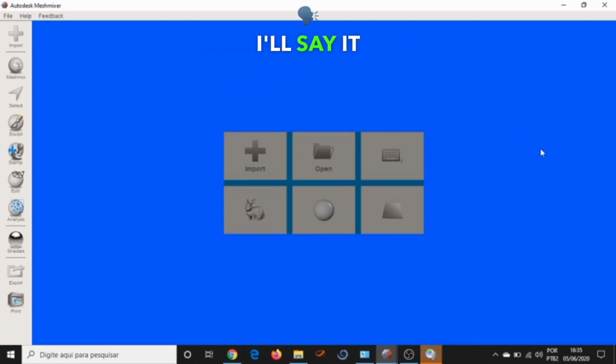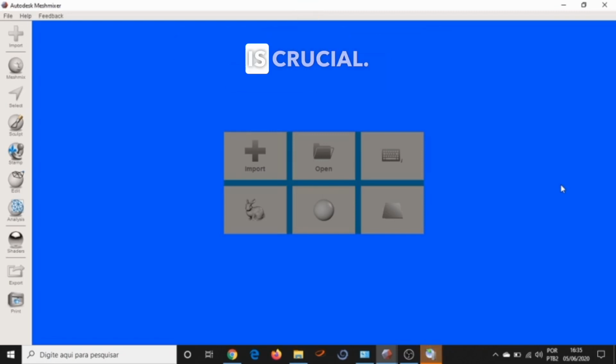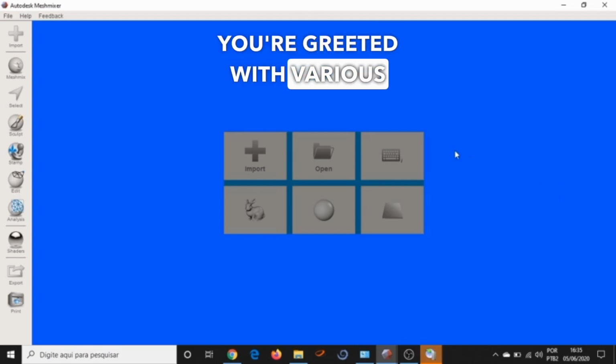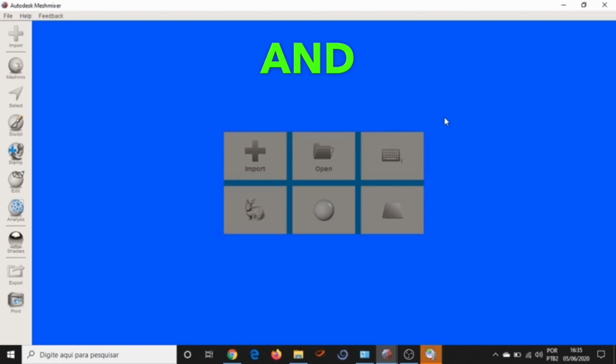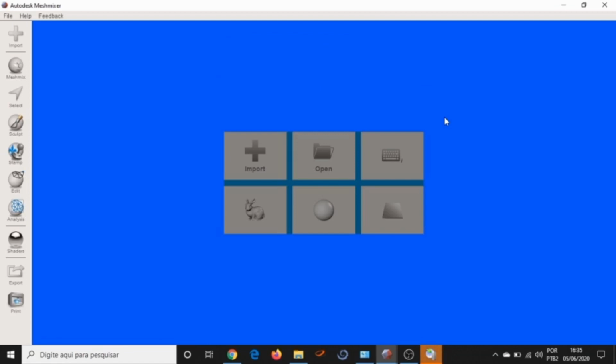As I said, and I'll say it again, we had the idea to do this course starting with an introduction of the software itself, which I think is crucial. So the moment you open it, you're greeted with various tools, but let's initially focus on these 6 tools that are available here on your screen. I'll briefly and succinctly discuss each of them so you can understand.